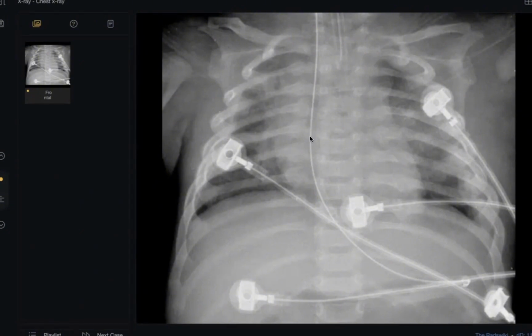Okay, what else? Before you request, are you in pediatric radiology or not? This is an important question. You are not in a pediatric radiology, so what is your next step? My next step would be to consult a pediatric radiologist. Excellent. And it is normal. What would you do? Then I will request follow-up X-rays and the history of the patient.